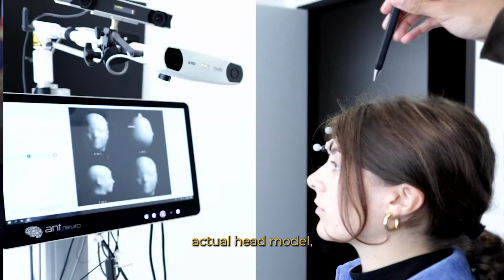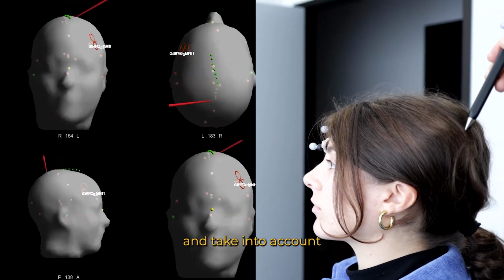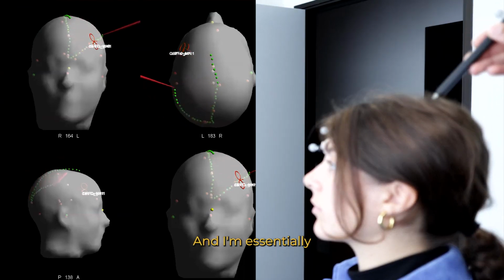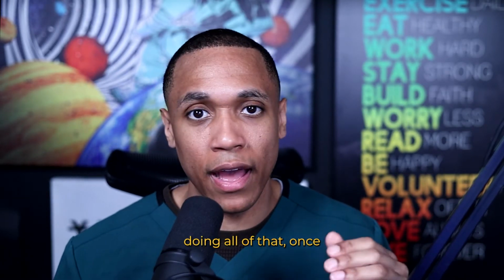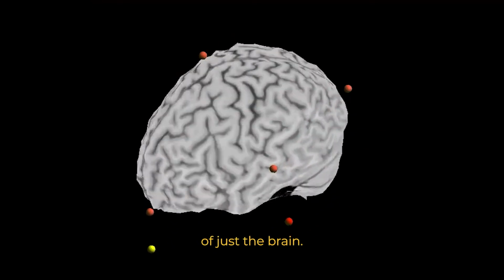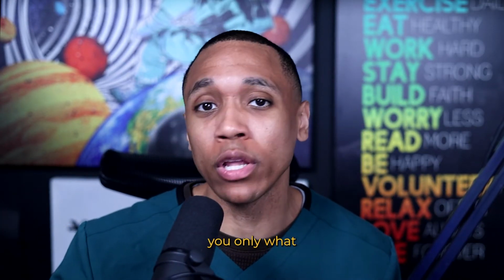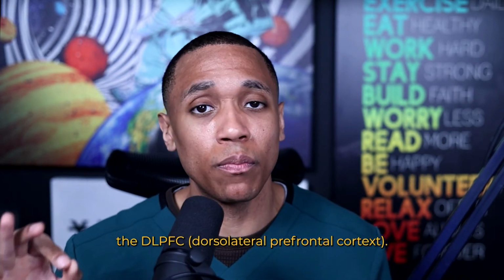Okay. Now, once we get this actual head model, I'm also going to add in even more specificity and take into account other factors such as hair, again, size and shape of the head. And I'm essentially going to outline, telling the computer the size and shape of the brain. And after doing all of that, once you know where the skull is, once you know where the brain is, I can actually separate the two of them and come up with an actual model of just the brain. Because now that I know where the skull is, I know where the scalp is, I can take them apart in the computer and show you only what I need to show you. The only thing that I need to think about now is the DLPFC.